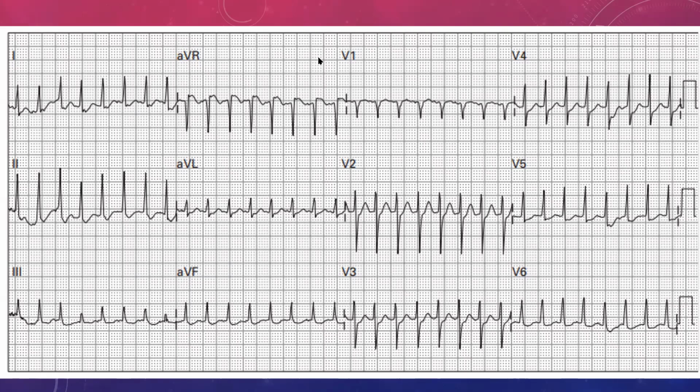Okay, we have one answer here. Let's have a look and see. Very good. Supraventricular tachycardia. That's brilliant. Okay. So you can see it's not actually that difficult. A tachycardia that's coming from above the ventricle is a supraventricular tachycardia.